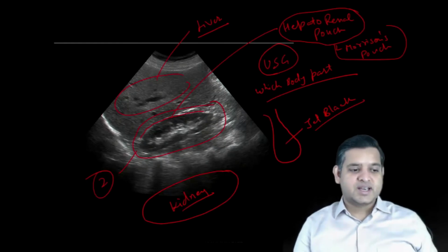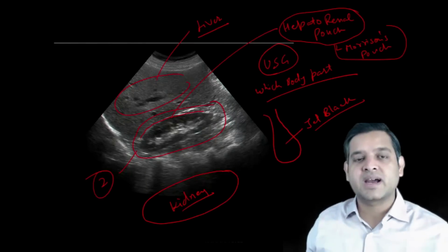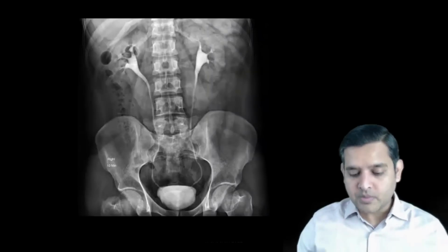So please take care of these small points that are there. Okay, I think you can identify that this is an ultrasound. Alright.